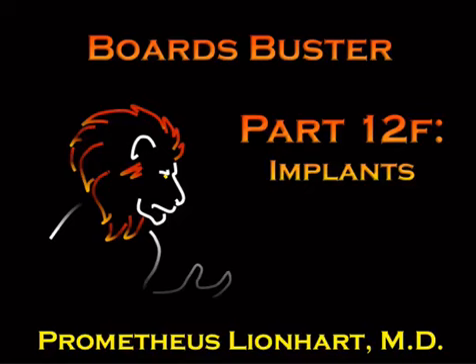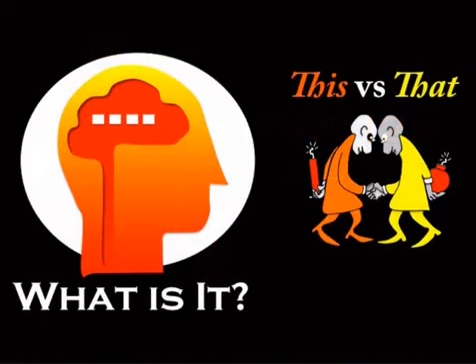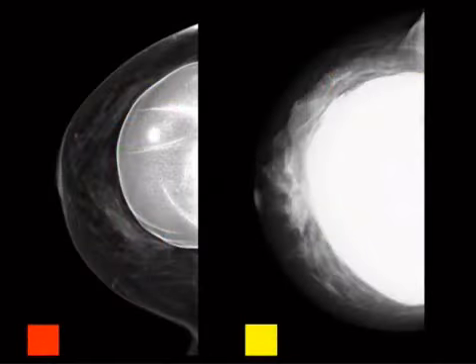Okay, so this is a module on breast implants. Starting out with a quick this versus that. So we've got two different mammograms here, both of which have breast implants, but they're different. So which one is which? Just point out a few things here.